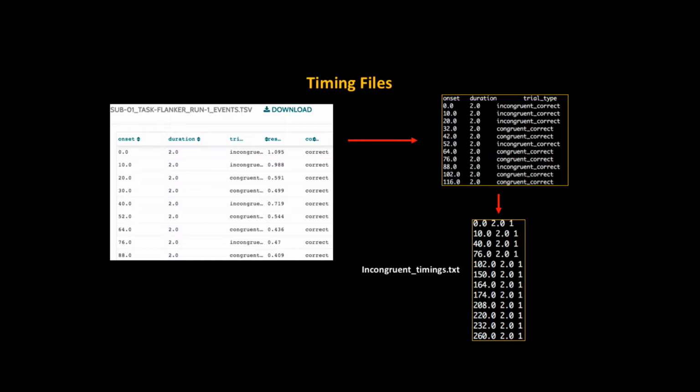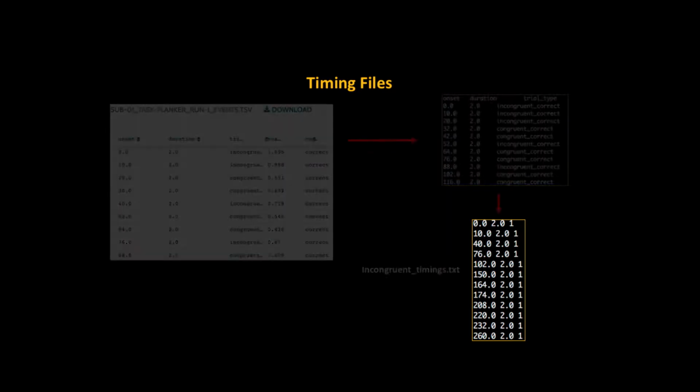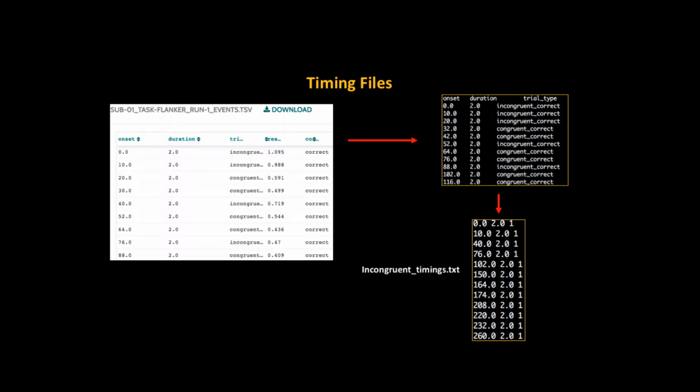If you look at what's going on, there's a lot of Unix stuff, I'm not going to cover it, but it formats everything first in FSL format and then transforms that into AFNI format. That's for a few reasons, because I first gave one of these workshops in FSL, and then I thought, I already have the timing file. There's a very easy way in AFNI to just convert from FSL to AFNI, so I just use that command on it. So this is what you'd see with something like FSL, right?